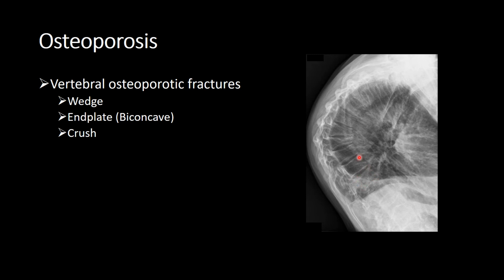These vertebral bodies are relatively well preserved. Then you've got slight wedging, and then you've got real wedging around the mid-thoracic spine. This vertebra is not that bad. And then again, real wedging of the upper thoracic spine. So we've got multiple compression fractures.